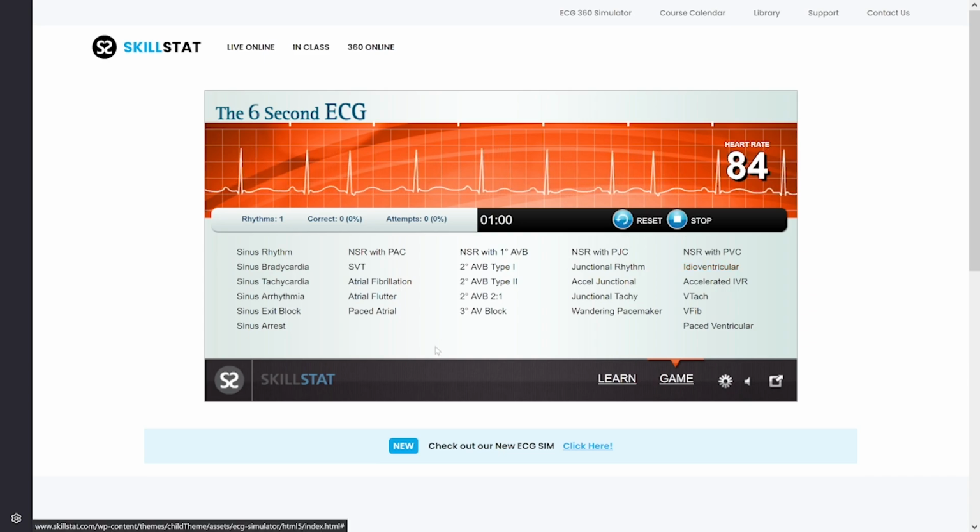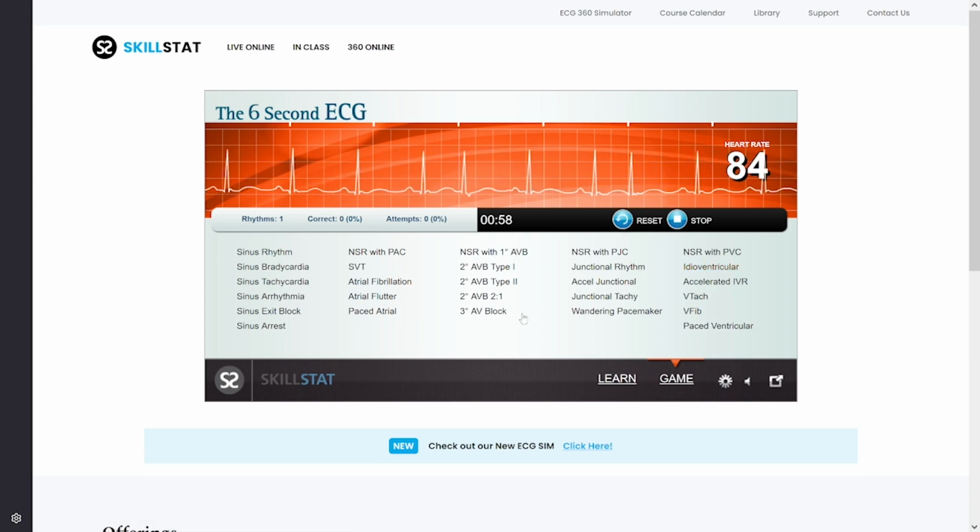Let's go again. Okay, what do we have here, guys? So take a moment to look at it. I'll give you a second. See that our heart rate is at 84 beats per minute. What do you think it can be? And don't be afraid to just pause the video if you need more time interpreting it.